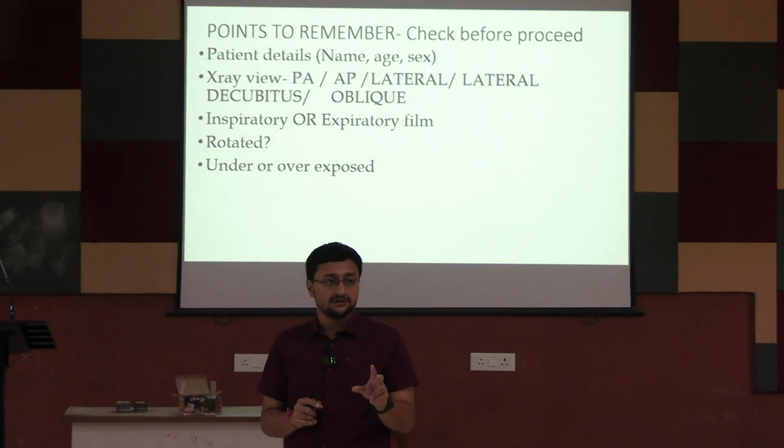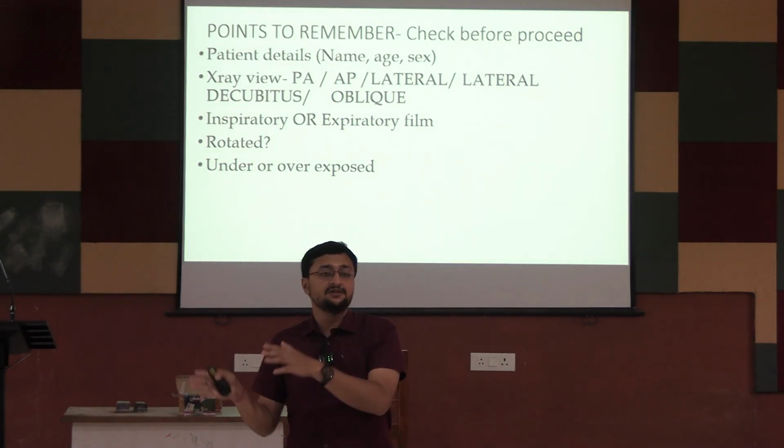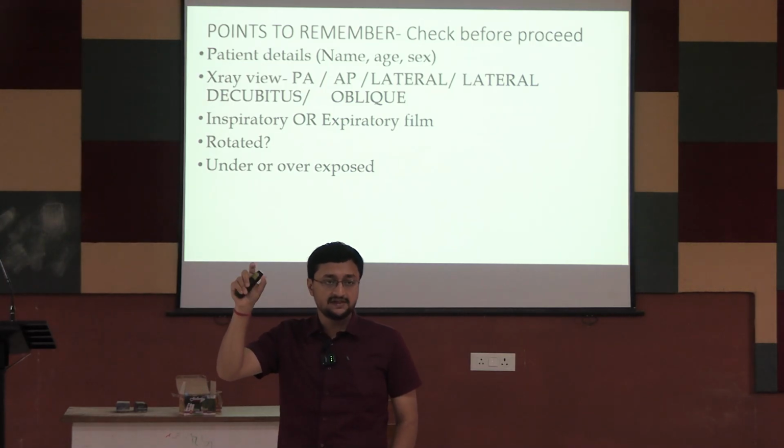Next thing is, what is the right side and what is the left side of the X-ray? That is mentioned over here, L or R, right? So that is a marker.